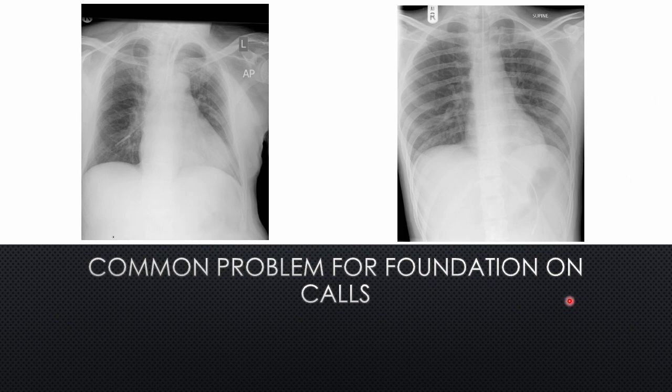Okay, good. So NG tube placement. There are a few things that you need to check. So obviously, to have it as a good chest x-ray, all the ABCDE we went through, but the NG tube should remain in the midline, which it's doing here. Good. It needs to pass the level of the diaphragm. Now this doesn't do that, so the diaphragm is here, and the NG tube, you follow it down and ends up here, and so this is actually going down the right bronchus. And so this tube is in the wrong place.